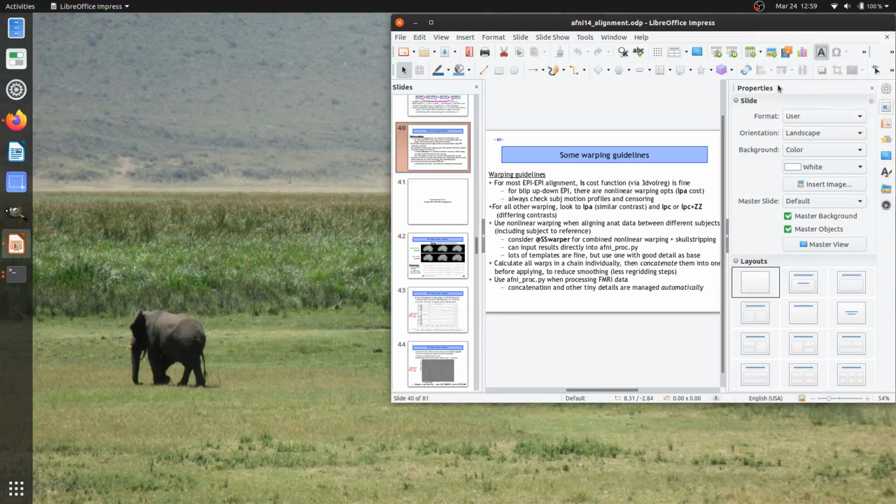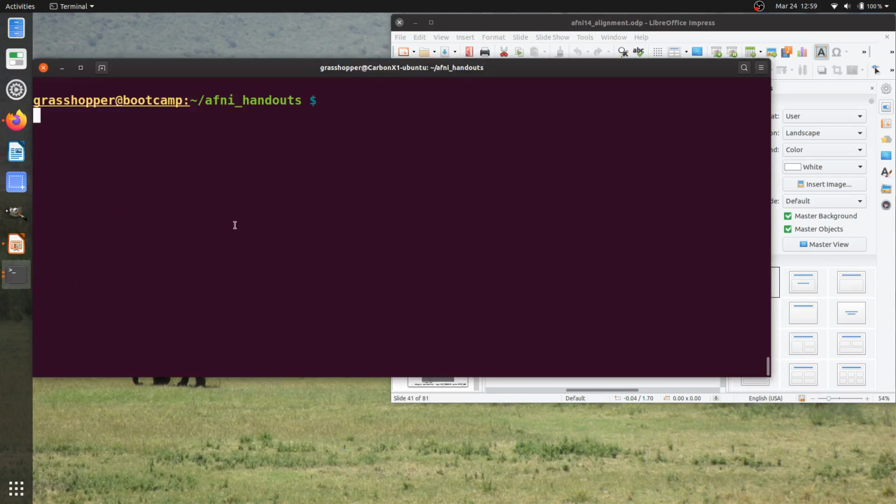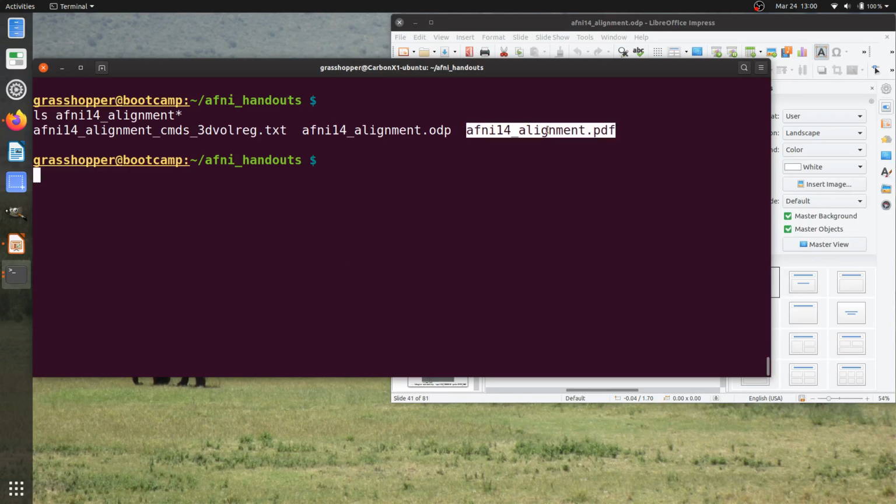Hello, in this AFNI video we're going to look at a particular kind of alignment, in particular EPI-EPI alignment, so within subject EPI alignment. This is a continuation of the alignment talk where we looked at general principles. So you may have the presentation open already. It's the AFNI 14 presentation, so you can open that up.